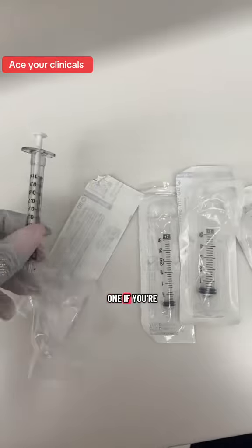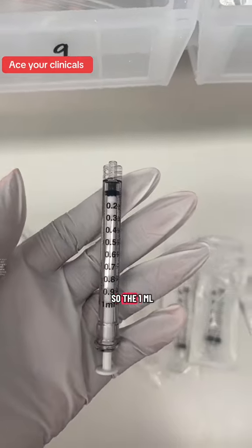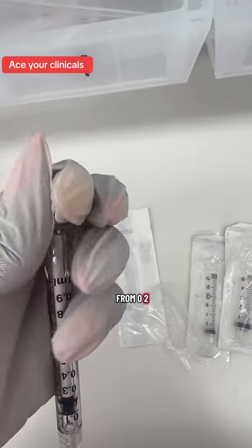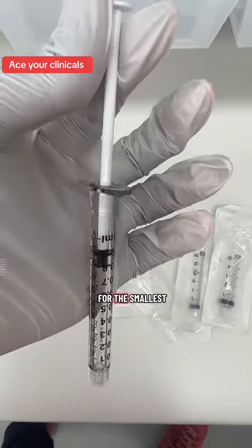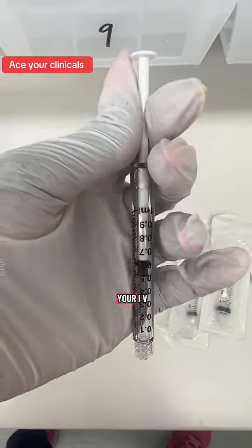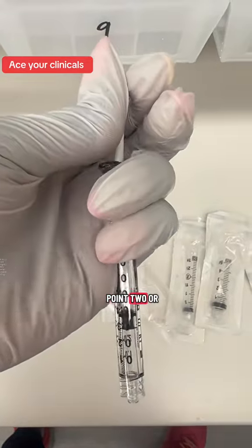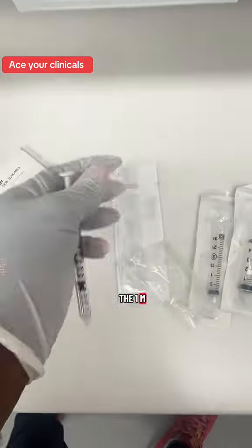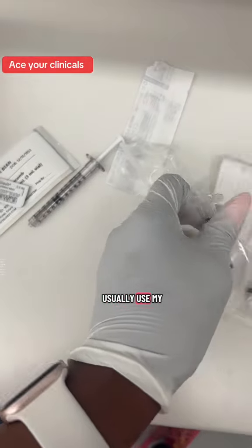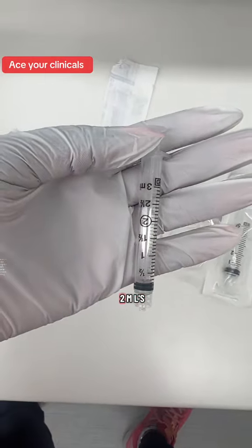The smallest one, if you're giving really small doses, goes from 0. So the 1 ml, this is what it looks like. It goes from 0 to 1 ml. This is for the smallest dose amounts of medicine that you're giving. Let's say you're giving your narcotics, your IV morphine, they usually are ordered 0.2 or 0.3 ml. So you use the 1 ml for anything that's below 1. And then I usually use my 3 ml for anything that's 1.5 ml, 2 mls ordered.